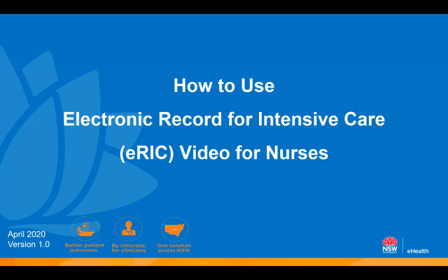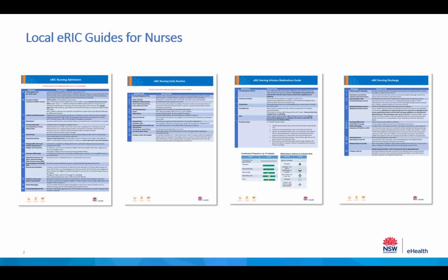The purpose of this video is to assist you in understanding how to navigate and document in eRIC whilst looking after a patient within the ICU. Please refer to the local eRIC guides made available to you by your ICU educator or team leader. You will also need to confirm what documentation remains on paper and what documentation is to be on eRIC. Let's get started.